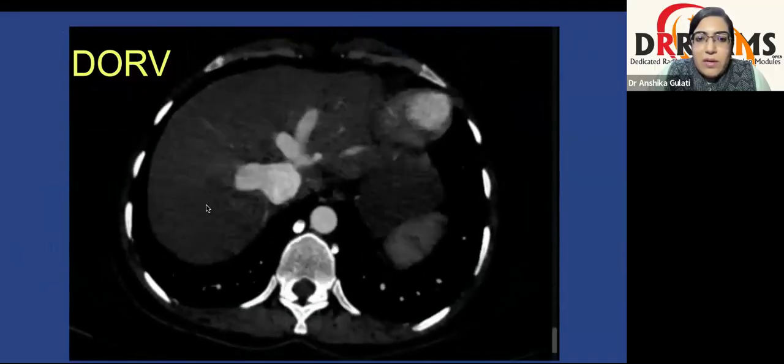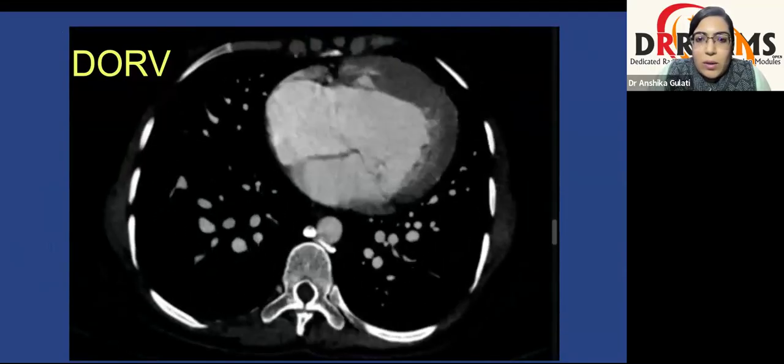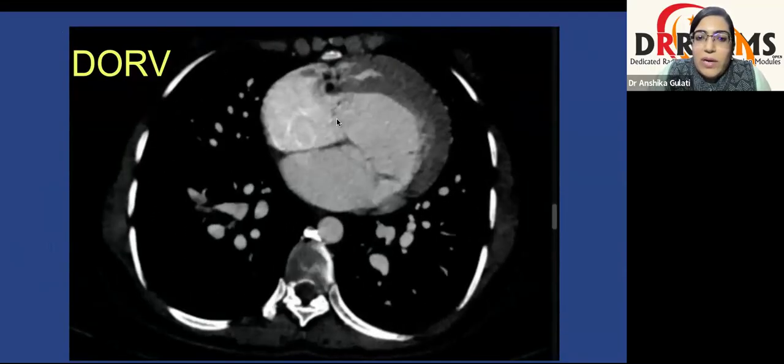So liver, IVC on right side. This is situs solitus. Situs solitus, by the rule of veno-atrial concordance, tells us that this is RA, this is LA, and apex is pointing to the left. So this is situs solitus with levocardia.